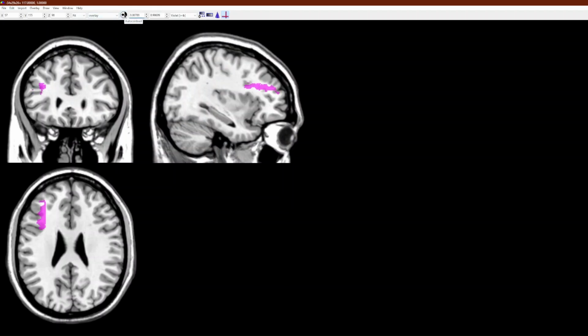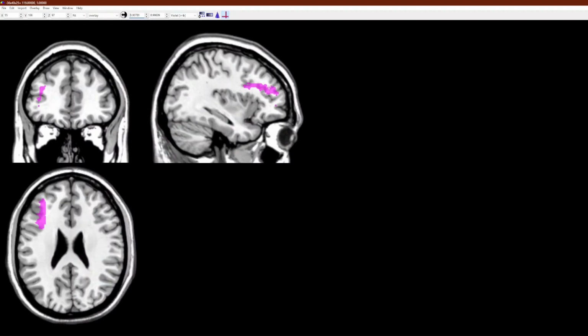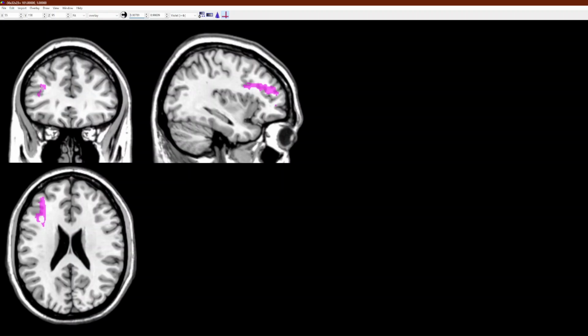So this button can also be useful as an auto contrast button. Look how bright that color is now. So usually you would have fMRI activation, some sort of bold signal, something like that, that can be input in here, or some sort of drawing as well. So we'll look at how to make those drawings or those overlays as well.